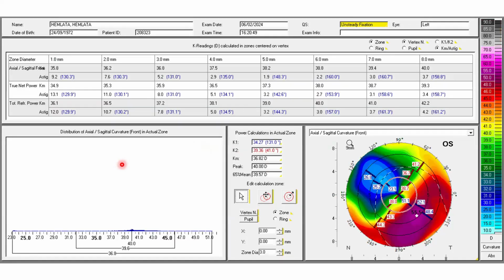One way to rectify this mistake was to consider the total corneal power map. Although we might not consider the total corneal power maps and their values directly to be input into the IOL power calculation formulae, just the distribution and the regularity of the cornea in this central 4.5 mm zone can be found out by using this map.